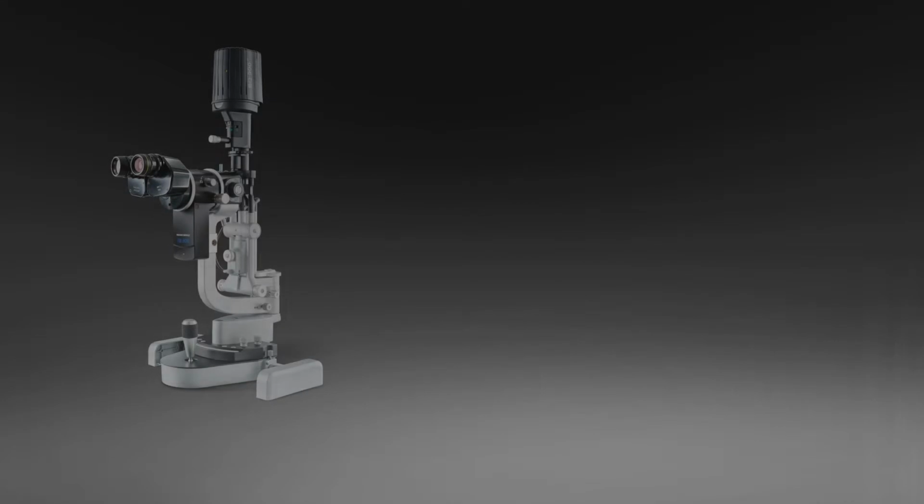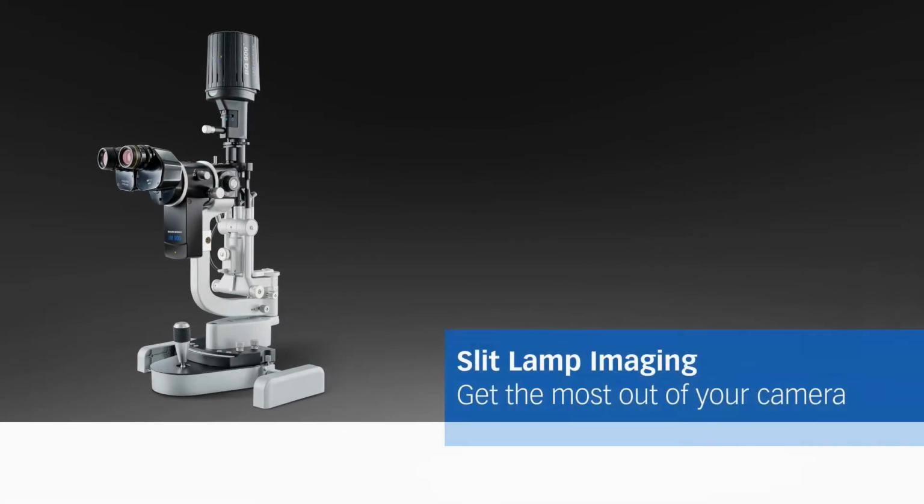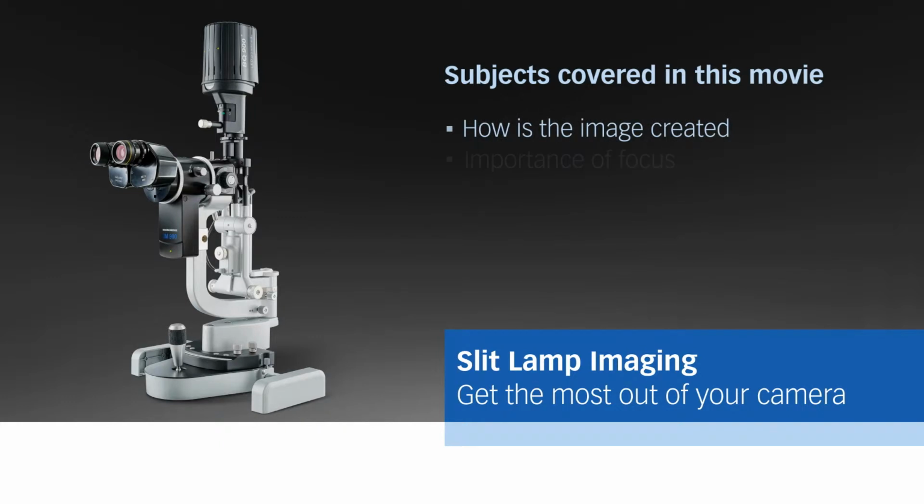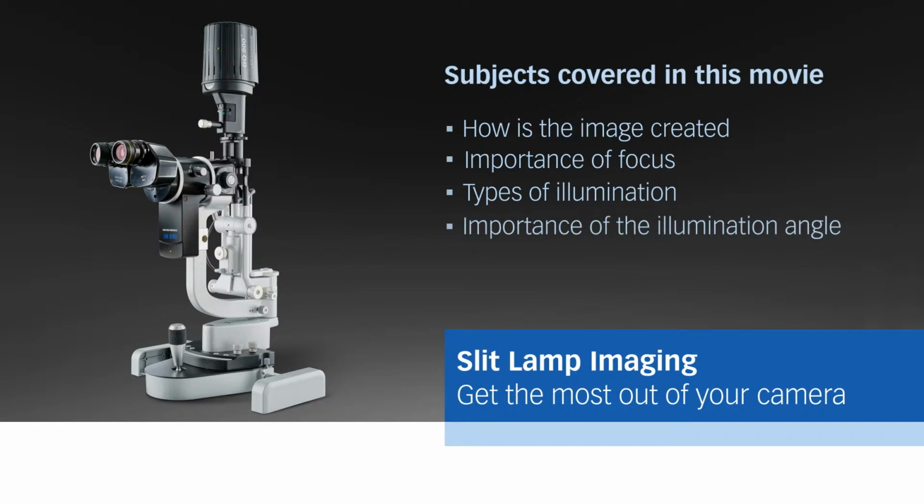Haag-Streit would like to share some knowledge with you that will help you to get the most out of your slit lamp camera. The following subjects are covered in this movie. How is the image created? Importance of focus. Types of illumination. Importance of the illumination angle. Tips from our experts.